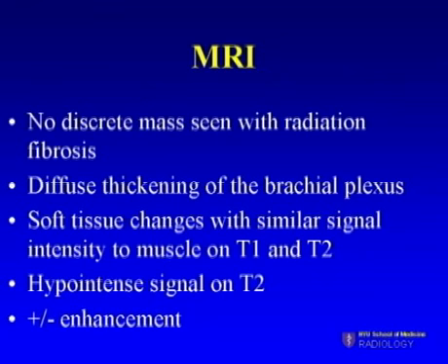However, it's been shown by numerous authors that this depends on when scar forms. Typically in an early setting post-radiation therapy, you may get hyperintense signal, and so it may not always necessarily be the case. In terms of enhancement, both metastatic disease and radiation fibrosis from vascularized scar tissue may also enhance, so it may not necessarily always be beneficial.